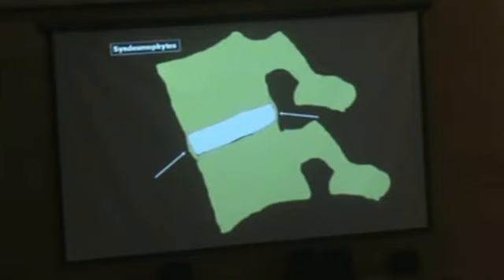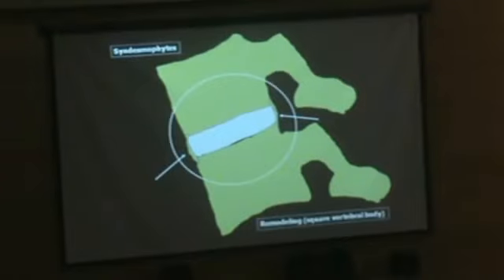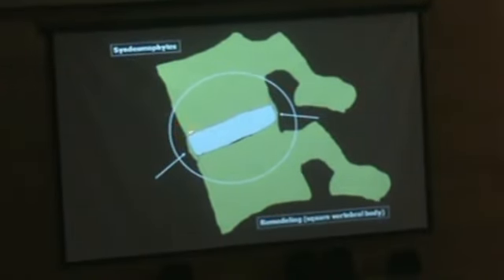This is a very important feature when assessing any exam from a patient with suspicion of spondyloarthropathy, not only ankylosing spondylitis. As well, we can see some remodeling of the anterior and posterior corners, and we're going to have a feature that we see often on every imaging method, which is the square vertebral bodies. And this is a very important feature as well.